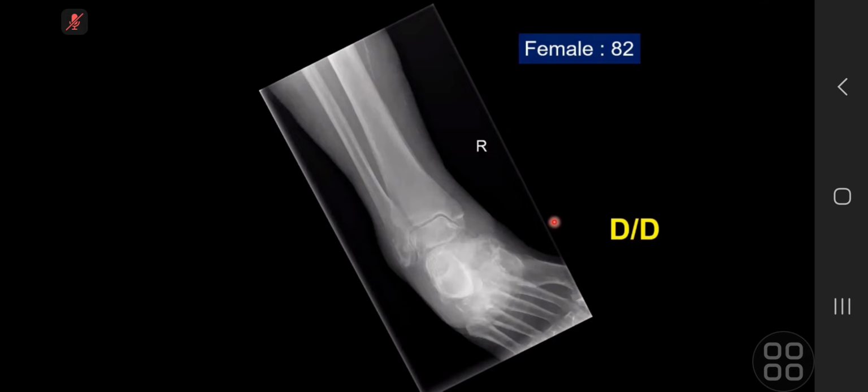So it can be HOA as well, but then it can be vascular insufficiency related to deep venous thrombosis disease or varicose veins. You see any stigmata on this case? There are vascular calcifications that I can see.